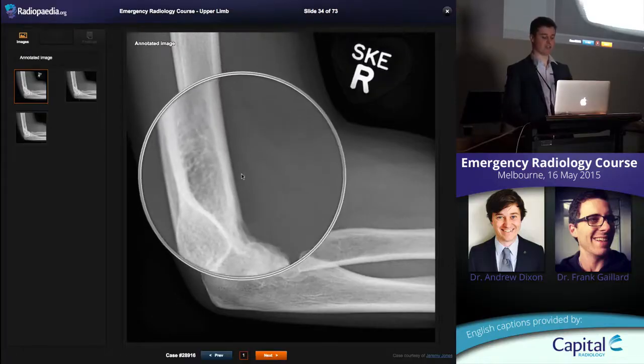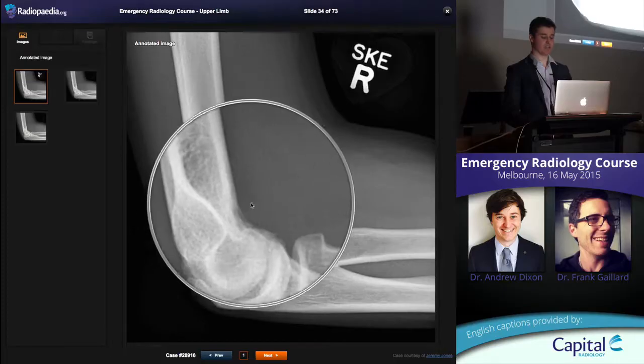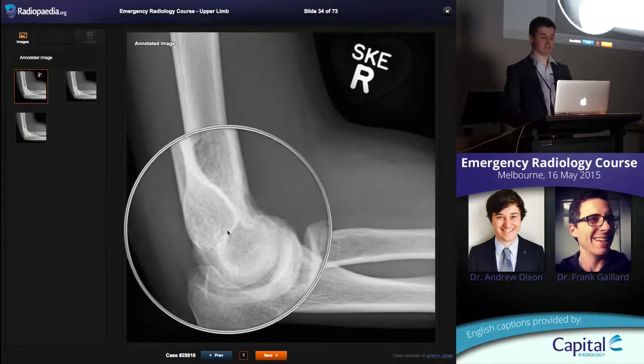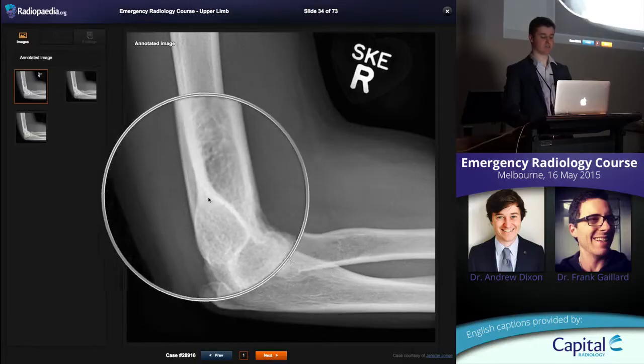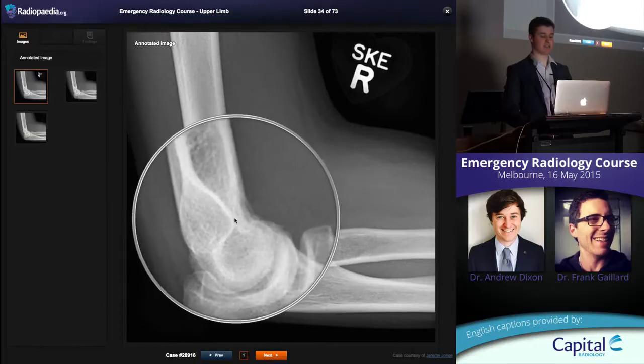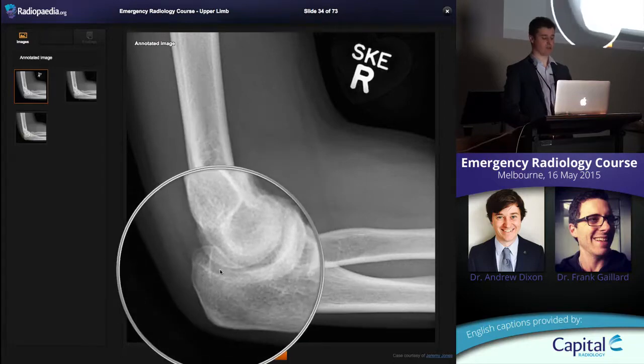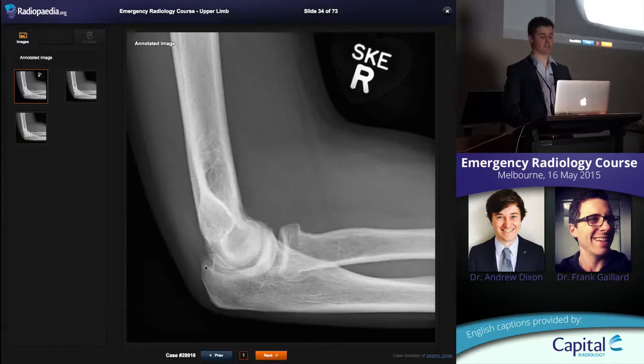There's a little bit of fat at the anterior aspect of the humerus, which you can't really see in this patient. And there's fat that sits inside here. This is the olecranon fossa. See how this very thin bit of bone, that's the supracondylar humerus here, very, very thin. When you extend your elbow, this olecranon process comes up and fills up this space back here. That's why it's full of fat, so it can accept that.